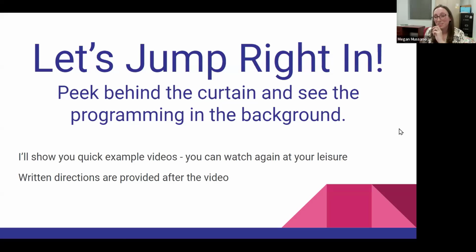Okay, so that's what the teacher saw, but that's not what we did. Let me show you now. Let's pull the curtain back. Let's jump right in and peek behind that curtain and see what programming it actually needs to take place. I'm going to show you a quick example video of me doing it and talking through. Again, this was during COVID, so I was just recording myself doing it. It's not the best, but don't worry.